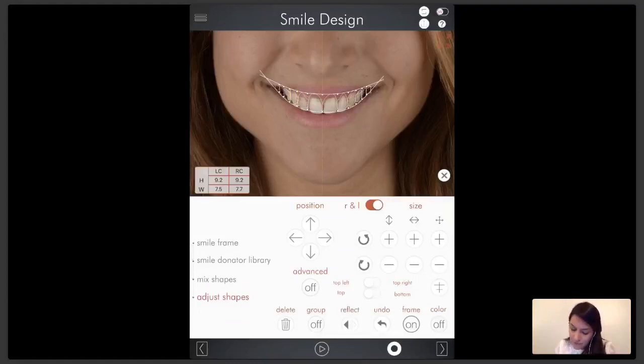So for example, these teeth in the back, sometimes they're way off. So I want to push them into the buccal corridor. If they're just too off, I delete them. So you can click on the teeth and delete, because we don't need those teeth. Okay, so here we just click on the teeth. We make them longer, we make them shorter, whatever you want, basically.